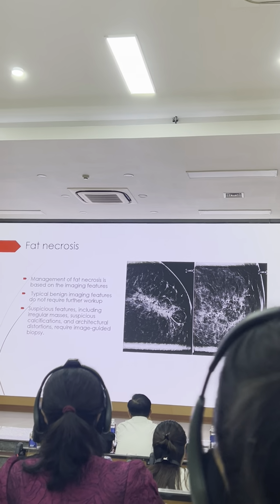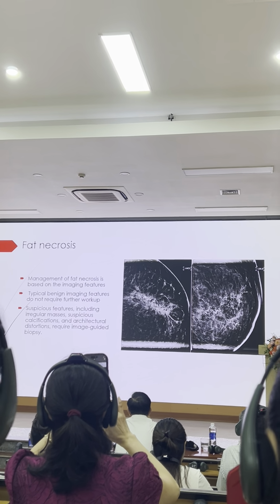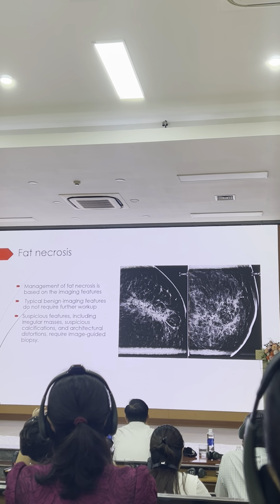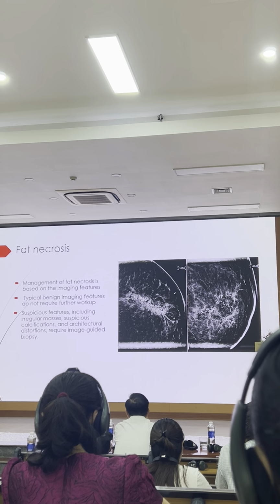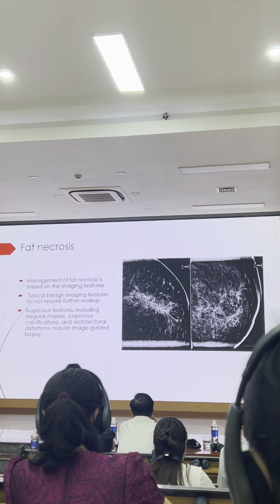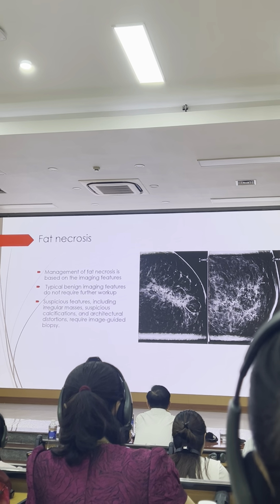So the management of fat necrosis is really based on the imaging features. Typically benign imaging features do not require any further workup, but suspicious features such as irregular masses, suspicious calcification, and architectural distortion do require image-guided biopsy.